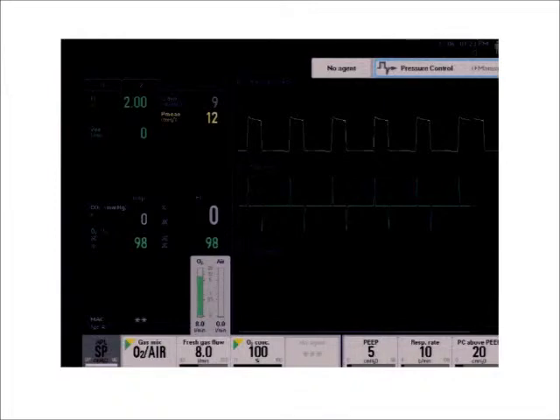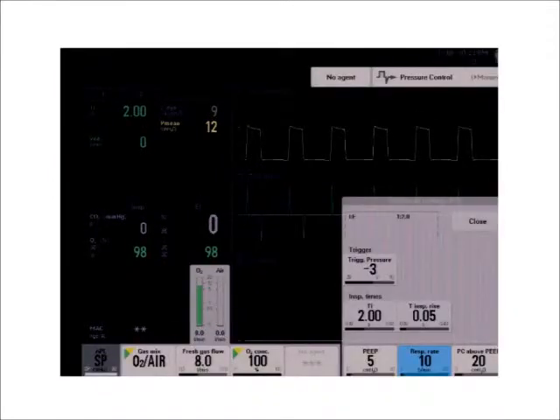Additionally, we're going to look at another measured value just to show what the compliance is in my test lung, and I'm going to be changing the compliance in a couple of scenarios. So what I did is, if we look at the top left-hand portion of the screen, I selected tab 2, and under tab 2 I can look for my measured compliance value, and it's gray here, and you can see it's 9. So I'll be changing this also.